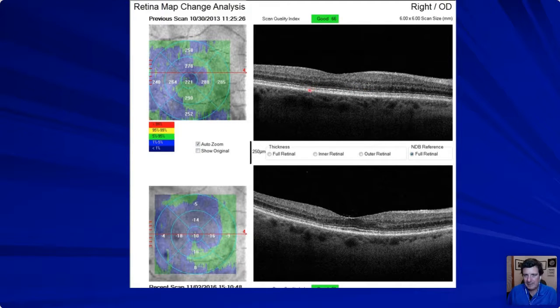Remember that Plaquenil builds up in the RPE at high toxicity, and then it starts, whatever the process is, to affect the outer retina, and it starts to come crashing down. 2013, Greg said that you have Plaquenil. We can watch it. It doesn't look too bad. We'll see how advanced it is. She's kind of young, so on and so forth.